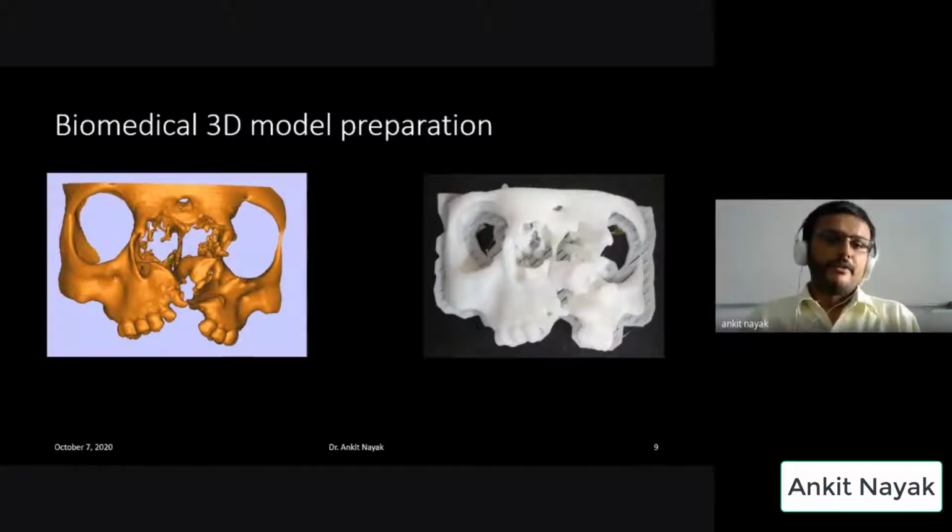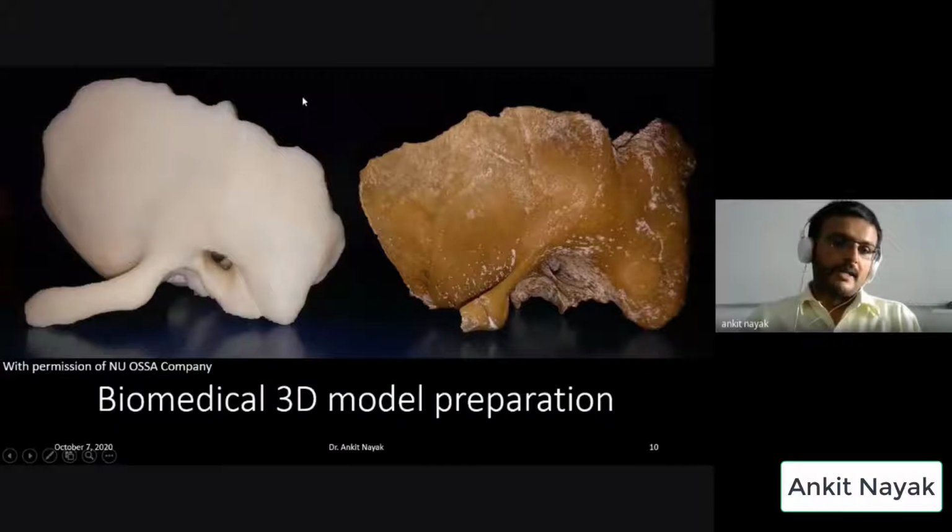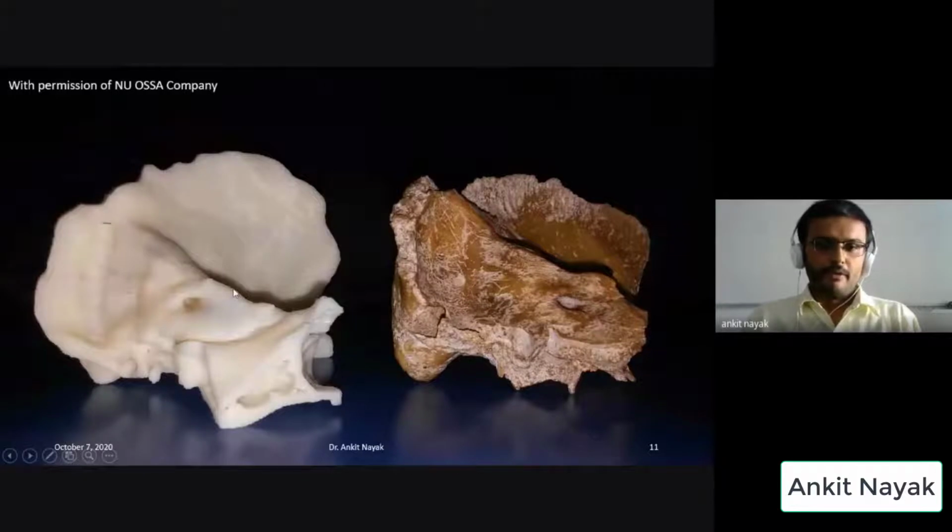Another thing is which tools you will use to model such complicated shapes, so that the STL file can be used for 3D printing. So we will talk about how we can develop the solid model or the FEA model of the patient from the patient data for the FEM analysis. Similarly, here you can observe this is the temporal bone which was processed to form a 3D printed model, which is the exact replica, and this is the back view of the same bone.